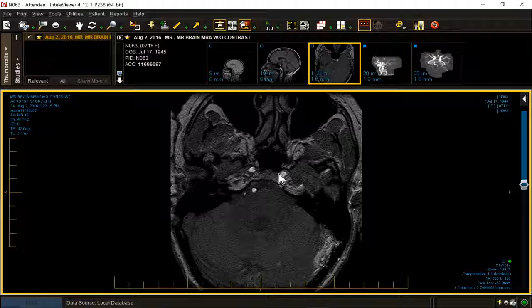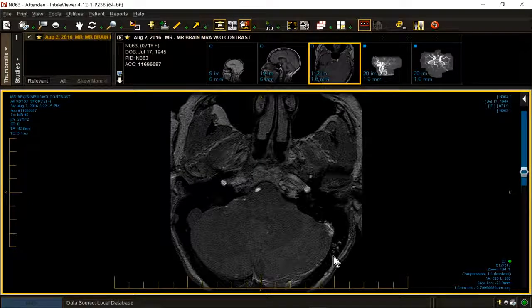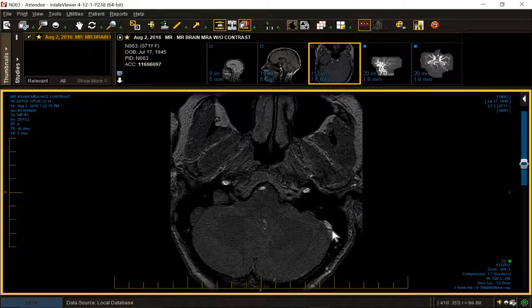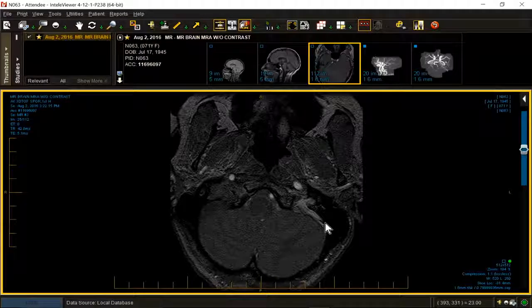There is a network of small vessels that are surrounding the left lateral sinus, depicted here. They extend for a variable distance. They start to fade away as we reach the sigmoid sinus, although the amount of contrast enhancement in the left, as opposed to the right sinus, is greater.